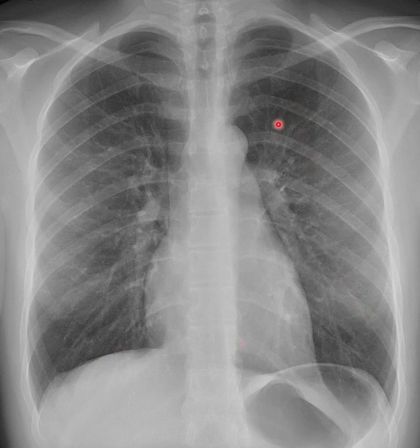If we don't see these little lung markings and it's very black in this area, it could mean that the patient either has a pneumothorax or that we may have used too much mAs and burned out the visualization of those lung markings there. So it has a lot to do with the technique that we set for our chest x-rays.